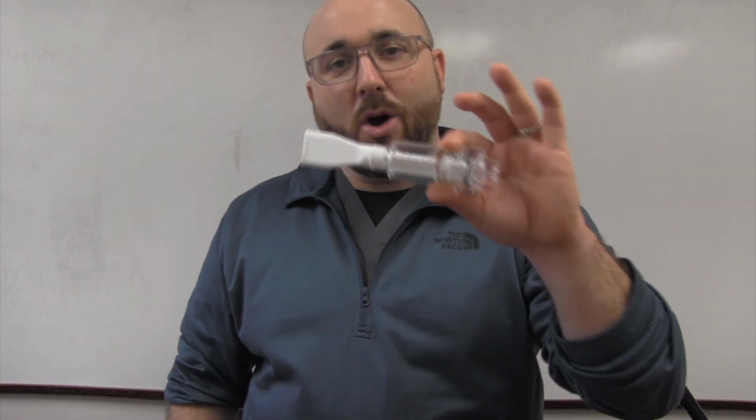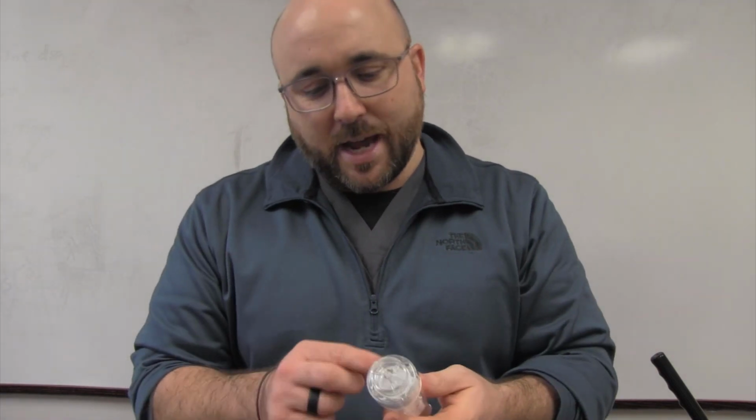It also, with that kind of quick air coming in and some changes to your airways, could cause you to cough and release a little bit of secretion. But it is going to work for training your muscles. So I'm going to pull this thing out of the category I had it in. I had it in the category with the incentive spirometer and the EasyPAP. This is its own beast. So this is an inspiratory muscle trainer. You don't see a lot of these, but if you do, look at it, it says IMT, and you'll know that's what this is for.